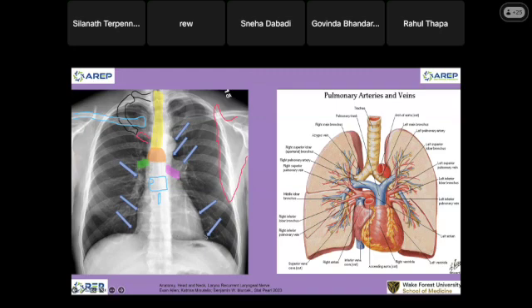All right, very good. So we are done with the airways. We are also done with the common location for the pericardial cyst, which is a soft tissue benign lesion.